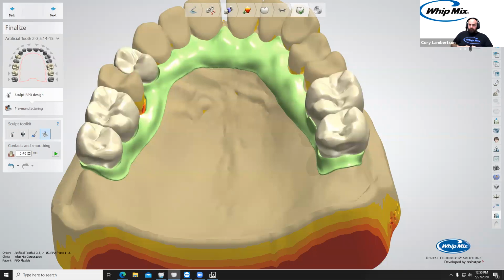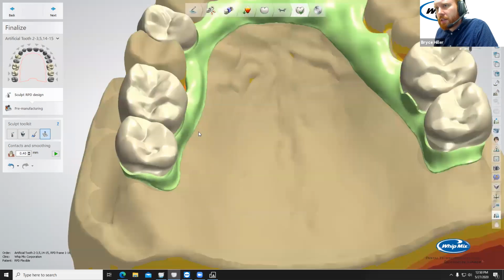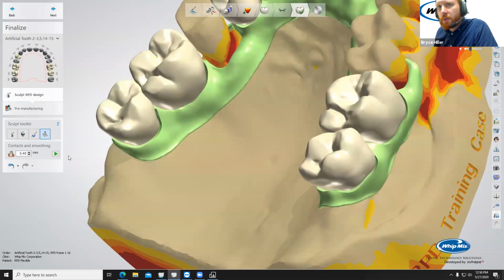0.4 means it's how much it's reducing underneath the teeth, correct? Yeah, I think that's actually extra space, so we don't want that. You'd actually want that to be very little, maybe like, I don't know, 10 microns. Just a little bit of extra space. I think you have to undo the previous cut. Oh, yeah, I think you're right. Previous 2 cuts. Yep.